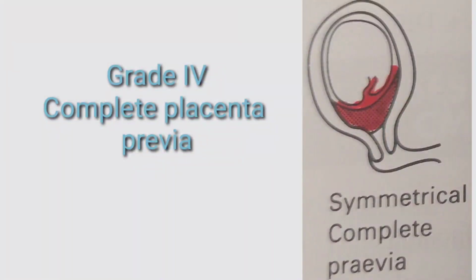Quite often we pay attention to the baby, we pay attention to the fetus and its internal structure, and we often forget the status of the placenta, but that is vital. So this was the grade 3 and 4 staging of the placenta previa.